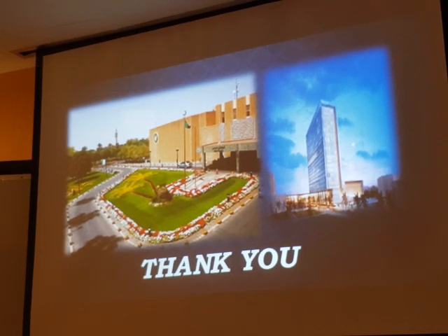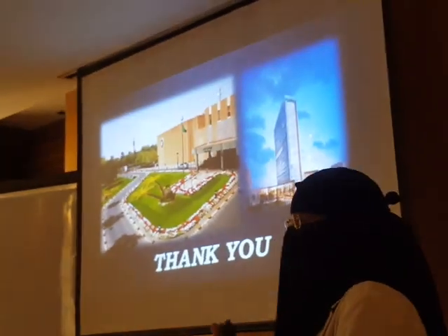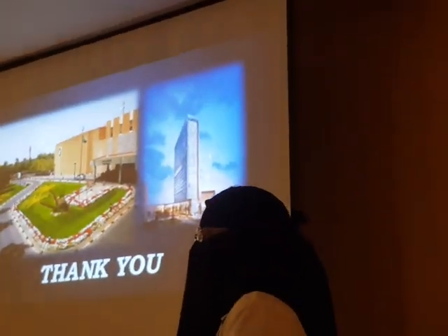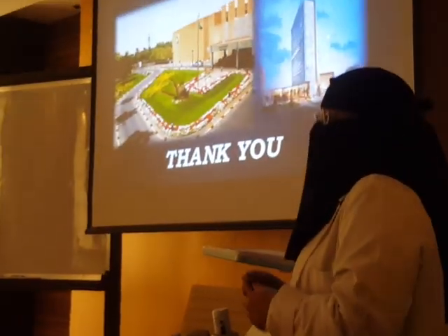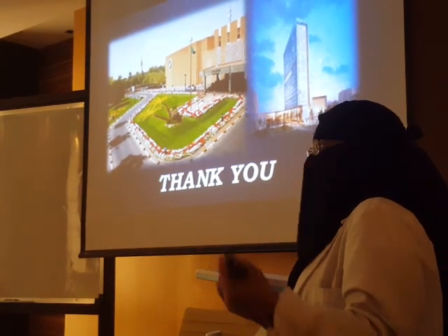Regarding the ileitis you mentioned, do we take it as large bowel, small bowel, or only small bowel? Both. Because colitis is in the colon and the small bowel is the ileum. We can see it in both. Inflammation can be in the small bowel or in the large bowel. Once you see it, you have to document it. And what is the inflammation exactly? That's why we have six images, including the small and the large.